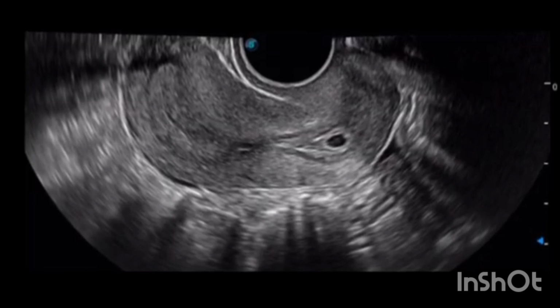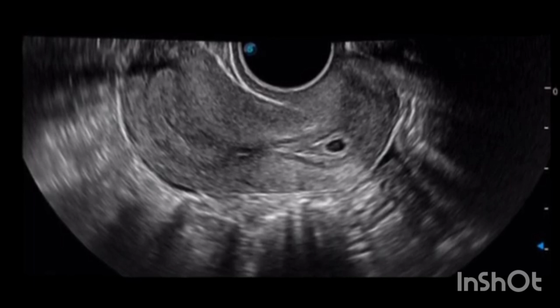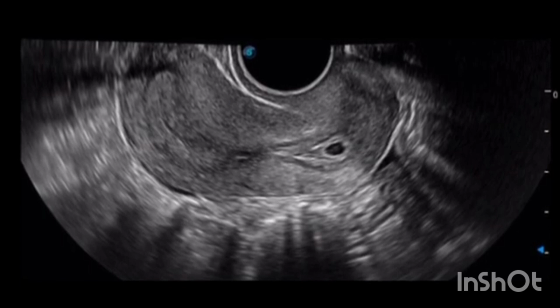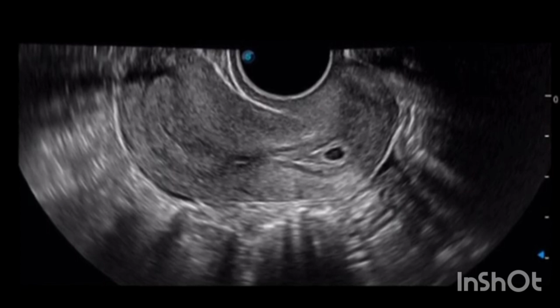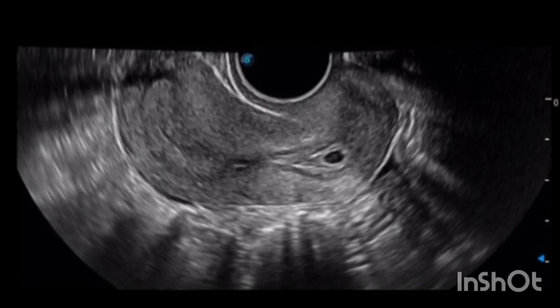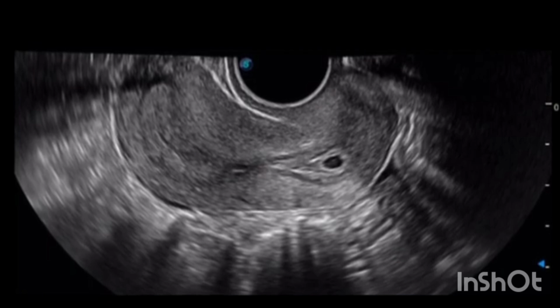Ultrasound diagnosis is based upon an empty endometrial cavity, the cervix is barrel-shaped, and the gestational sac is implanted below the level of the uterine arteries, that is below the level of the internal cervical os. There is an absence of a sliding sign. When pressure is applied to the cervix using the probe in a miscarriage, the gestational sac slides against the endocervical canal, but does not do so in a pregnancy implanted in the endocervix.